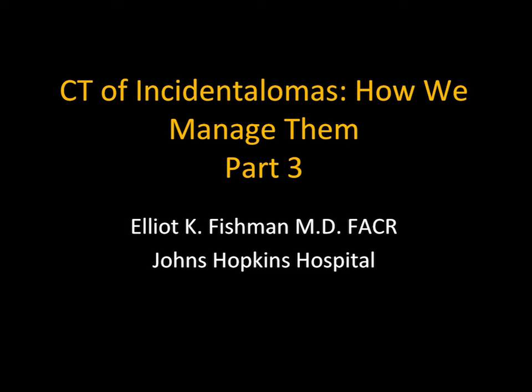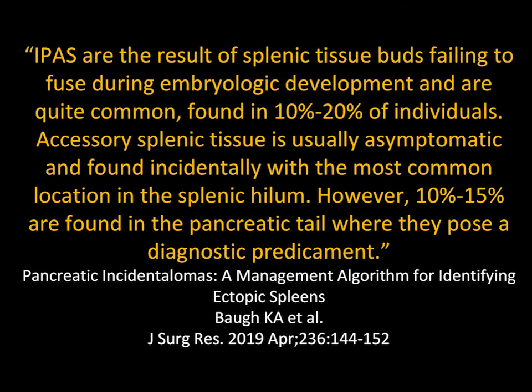In the prior two parts, we had some discussions about incidentalomas, frequency, and some of the challenges involved. Then last time we spoke about some specifics regarding the kidney, the adrenal, and the pancreas. I mentioned that one of the things that transitions from pancreas to spleen will be this latest incidentaloma, and we're going to start with that, which are the ectopic spleens.